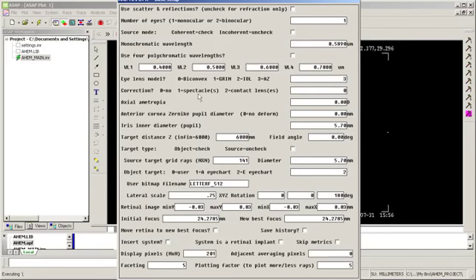Here I have an eye lens model choice. So I have a choice of either simple biconvex equivalent index lens that's controlled by power. I can have a gradient index lens, which is a complex shelled gradient index lens. I can insert an intraocular lens, an IOL, or I can use the Arizona eye model. So I'm going to choose that.